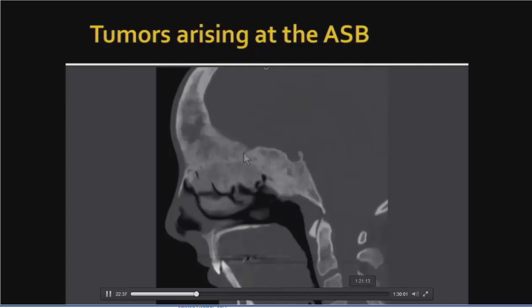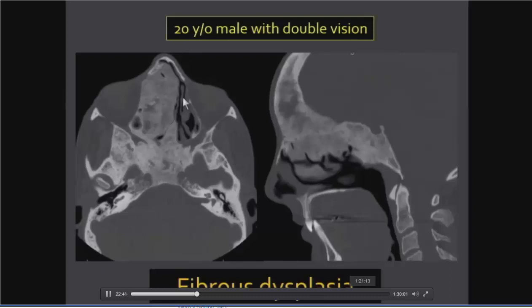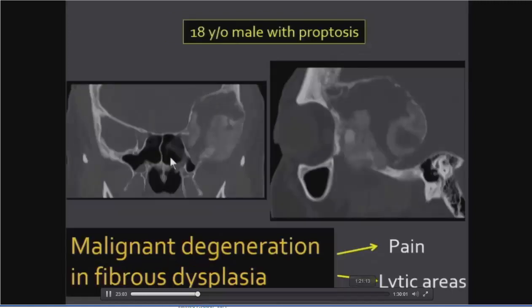Now moving on to tumors involving the skull base by itself, obviously because it is made of bone, we are going to talk about osseous or fibro-osseous lesions, and the classical entity you are likely to encounter is fibrous dysplasia. It has a typical ground glass type of appearance, expansile. It can appear very aggressive on MRI. So if you find something which is heterogeneous on T1 and T2 signal, enhances a lot, but seems to be primarily involving the bone on MR, please get a CT to correlate because CT will provide the final diagnosis.